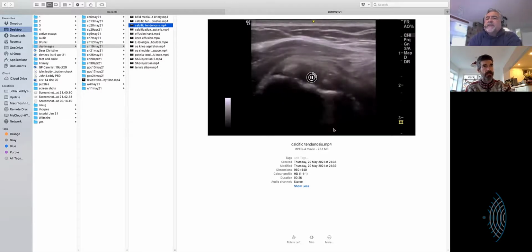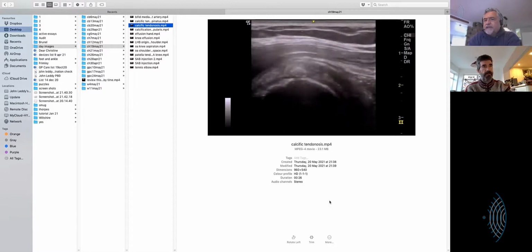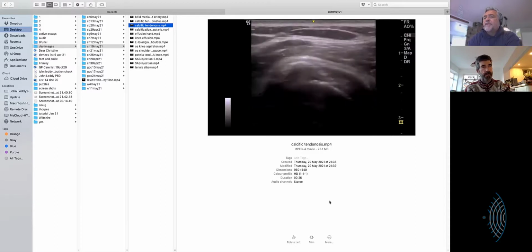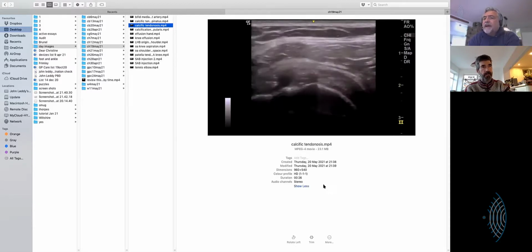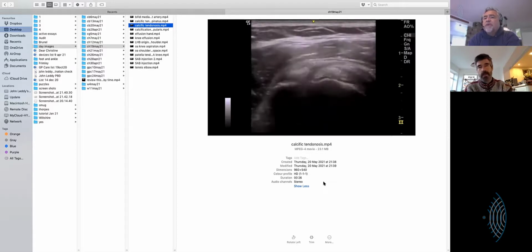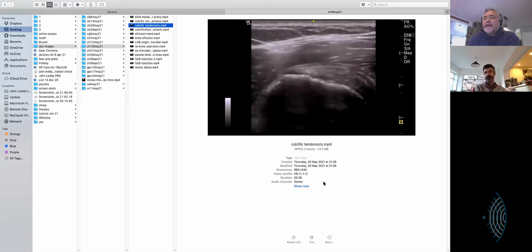My eyes see what you're showing me now as an infiltration of fibrous material by a calcinosis, whereas that other one almost seemed like an ectopic piece of chondral tissue, or a piece of calcification, like a big piece of debris. Yeah, and that's probably what's going on in what they would call the middle section, whereas the other area is probably further on in its evolution. Yes, and starting to disperse or soften or whatever.